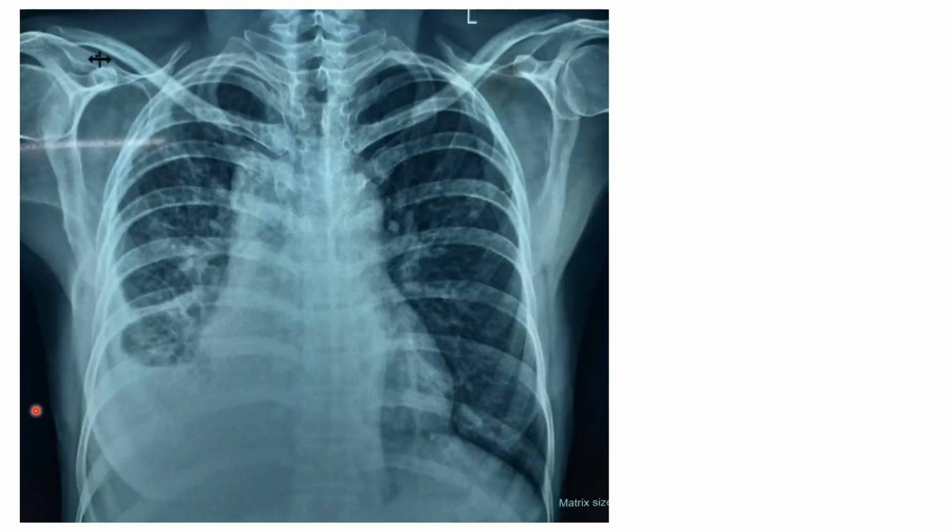Here is another X-ray where you compare the right lung and the left lung. So the right lung is smaller compared to the left lung. Disregard other findings as of now, just focus on the volume. The right lung volume is much smaller compared to the left lung. So this is a very important thing. As soon as you see the X-ray, you have to look at the gross volumes of the right and the left lung, and if there is any significant reduction in the lung volume, you should make a note of it.